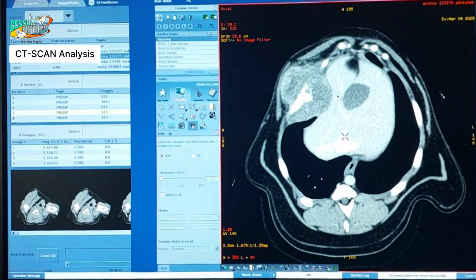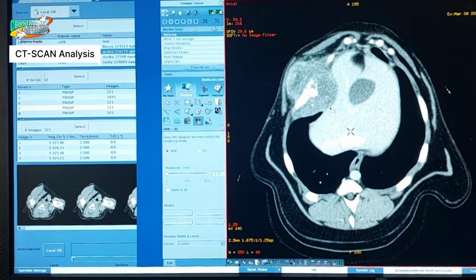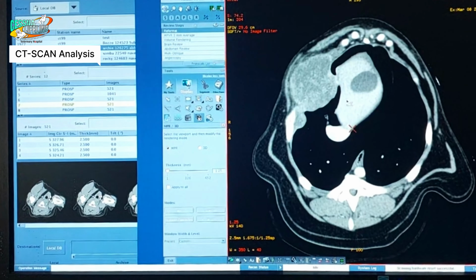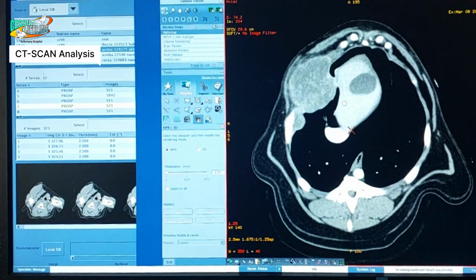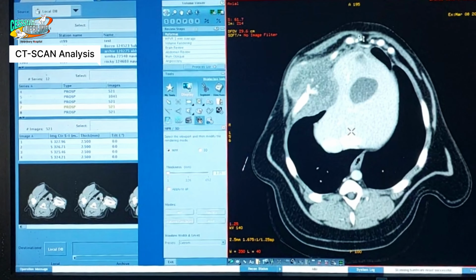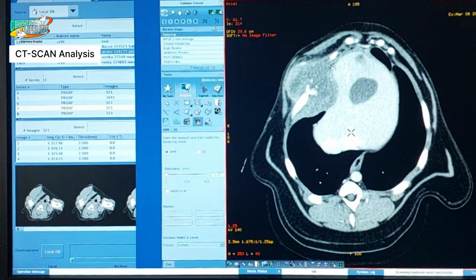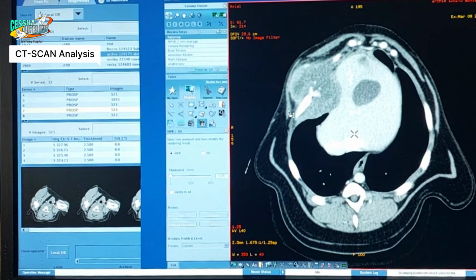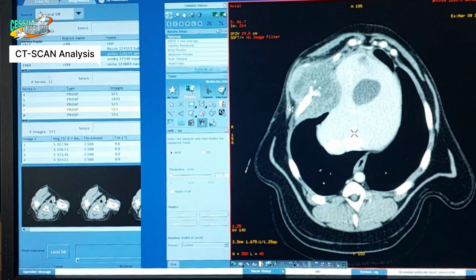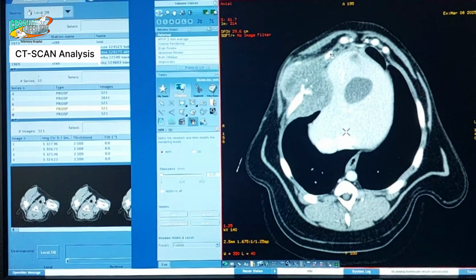We are planning to do the surgery, and we are going to resect almost 3 ribs. I'll show you the planning and all. In these cases, whether I need to put my mesh or not depends upon these muscles. This is the rectus abdominis muscle, which will help me to close this area once I remove this and once I cut all these ribs. This is the external abdominal oblique muscle. This is the oblique muscle. These 2 muscles I am going to separate from here, and then I am going to open and go for removal.